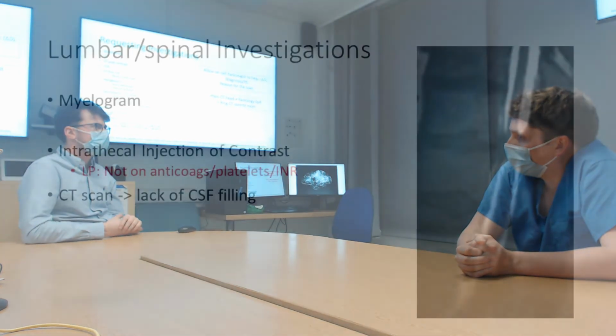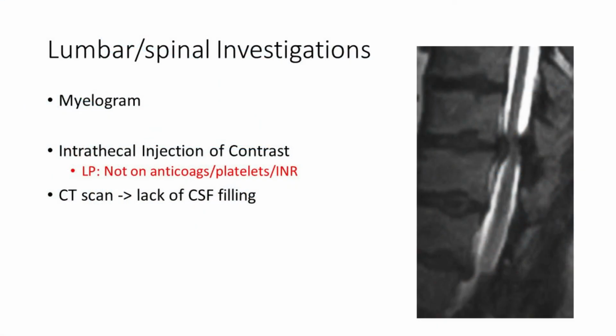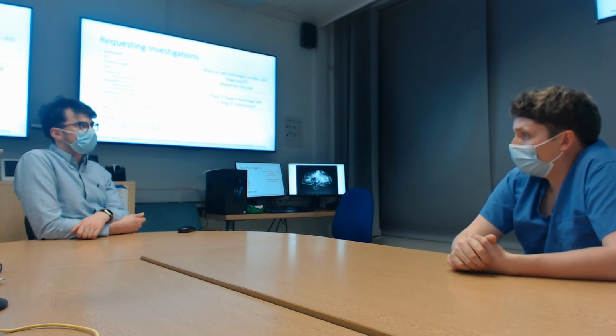More specialist scans that we've ordered, myelograms. So where you inject contrast, again the same type of contrast, iodine based, into the CSF, and that's mainly used in patients that can't have MRI scans, either because they've got often spinal cord stimulators, although they're now becoming more MRI conditional. But occasionally you'll find old patients with pacemakers that are non-compatible. They go for a myelogram, and then you basically see where the compression of the cord is, or of the nerve roots, depending on the level.